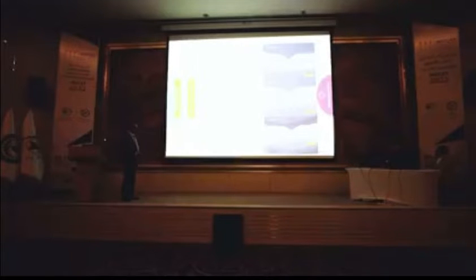But with this generation of OCT, which is swept source OCT, you can see this line which demarcates the interface between choroidal tissue and sclera. So in this study we are using this type of OCT.